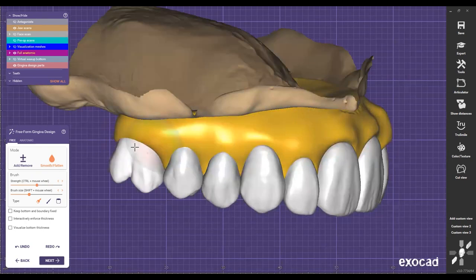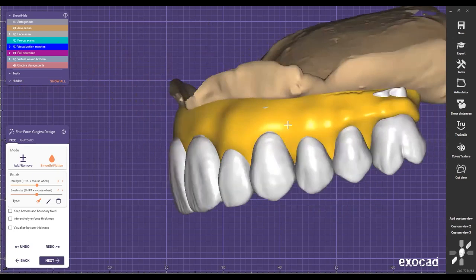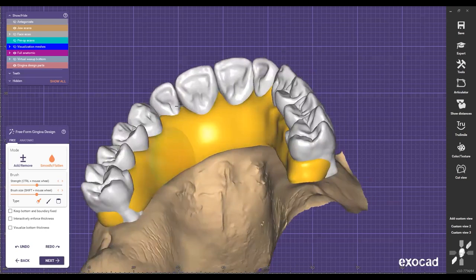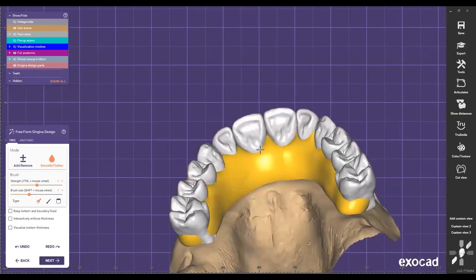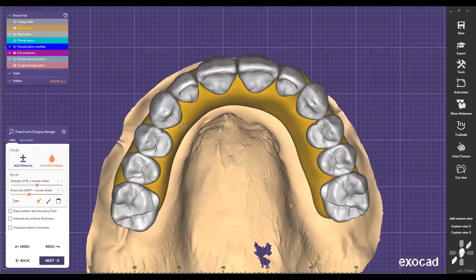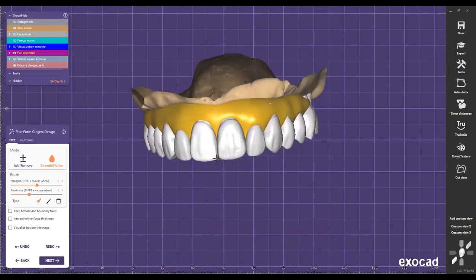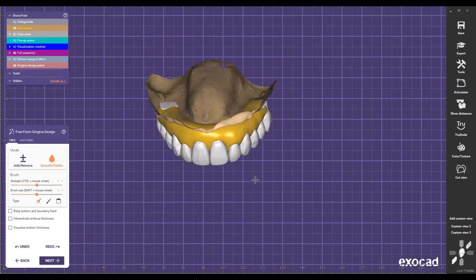And then I go right away and start getting the torch, and I go here all around and then start going here. Because if I start smoothing right away, then the material is not going to be spread properly. And then I'm going to have to go back and start filling areas, right? Now from here, I like to make sure that everything looks even, a nice horseshoe shape, because I don't want thin areas, thick areas, right? Same thing here. So once I have a nice area here, and remember, this is going to be up to the bone reduction, so you're going to make my life easier once I'm done.